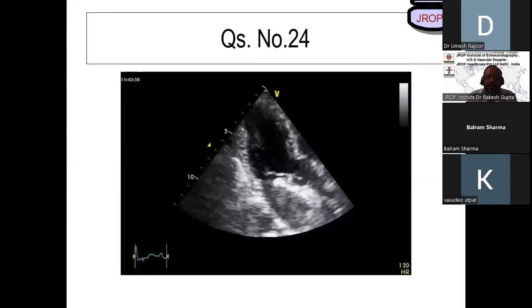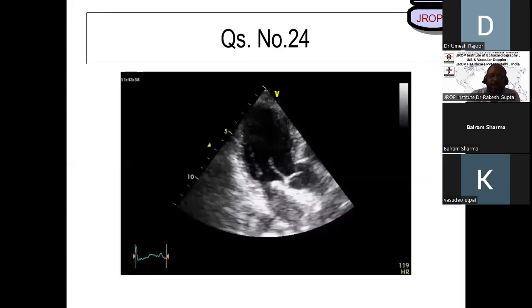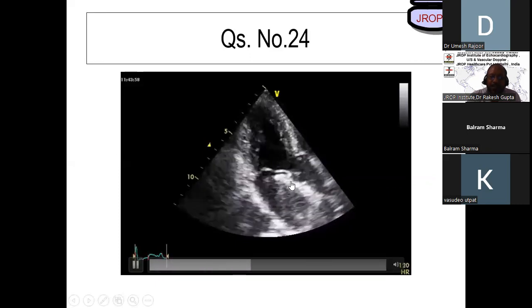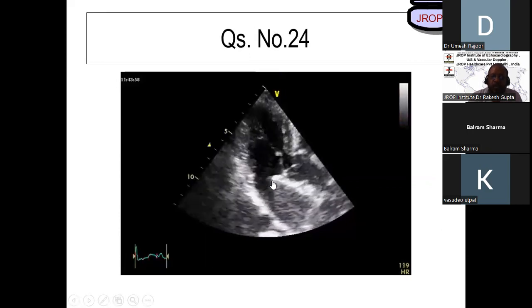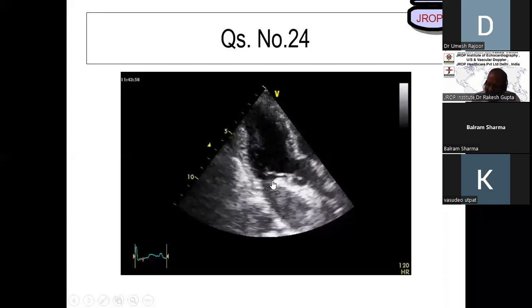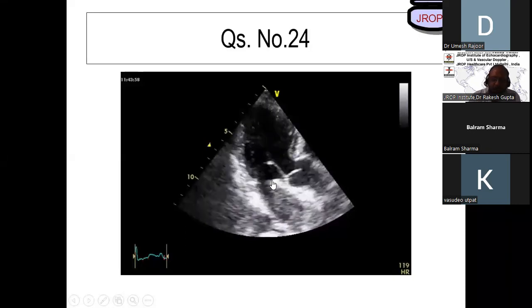It's abutting the mitral valve. Is a little bigger ASD device. Look at the ASD device, it is almost getting closer to atrioventricular valve margins, and the device is so huge that its impact is getting into the atrioventricular valve. There's nothing wrong with this device, but this is an oversized device for an atrial septal defect. I'll show you a couple of images subsequently of good size ASD devices, not oversized. Good answer. God bless you. Yes, Utpat.